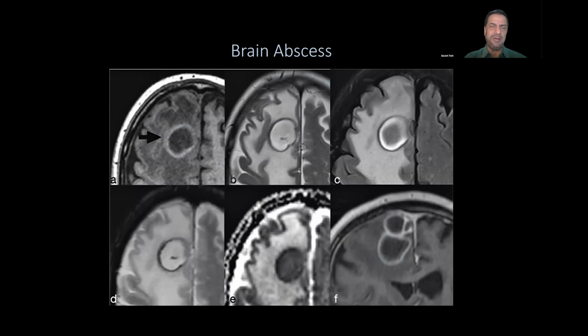But sometimes, if the wall is very thick and there is no immune reaction, no connection between the cyst and the brain, then there may not be edema, but most of the time they will have a lot of edema and then be symptomatic. Or they can be multiple septated cysts like this. Their wall is quite clear, and it looks tense from inside, trying to burst out.